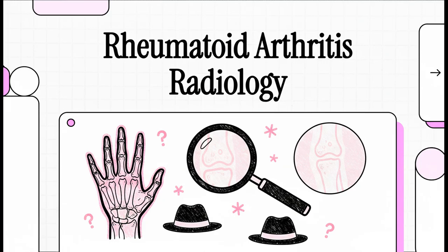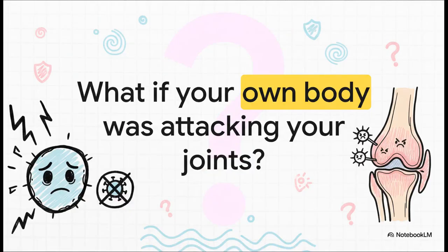All right, today we're going on a bit of a journey, a radiologic walkthrough of rheumatoid arthritis. We're going to play medical detective and use imaging to see exactly what this disease does inside the human body. It's pretty fascinating stuff. So just think about this for a second.